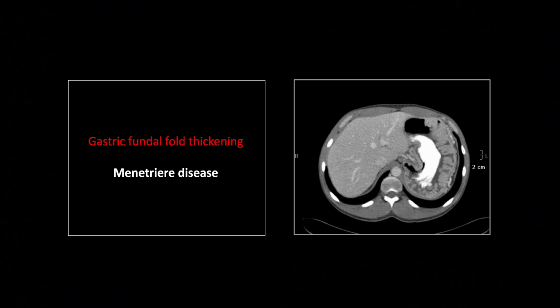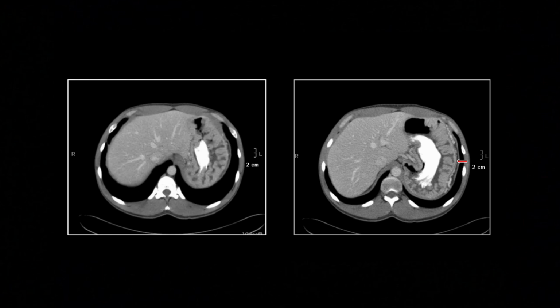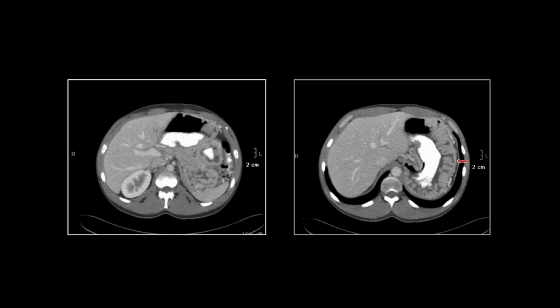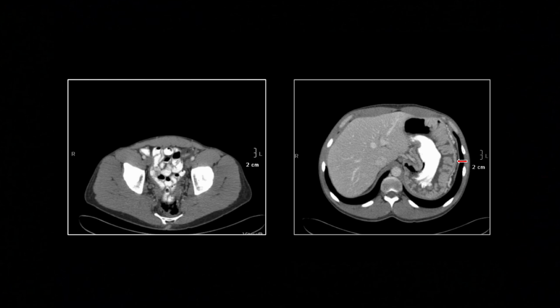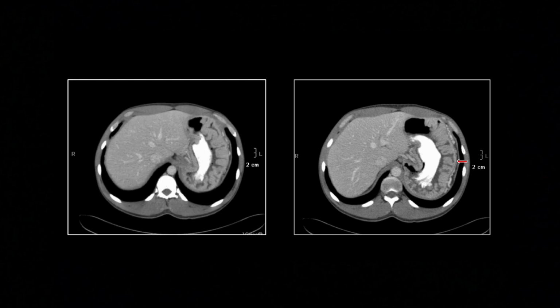All right. This is Menetrier disease. It's fairly rare, but it's worth putting in here just so if one comes across, you'll actually be able to recognize it. So this is not so hypodense. You can really see that this is hyperdense fold proliferation, just really prominent, thickened gastric folds with a particular location in the gastric fundus. Note there in the antrum, it really isn't so thickened. So this is just a perfect case of Menetrier disease with gastric fold thickening.